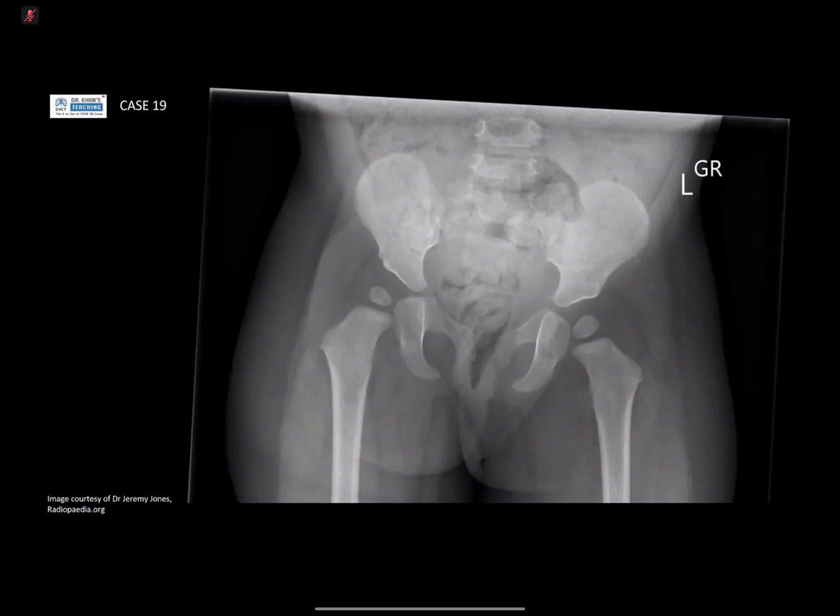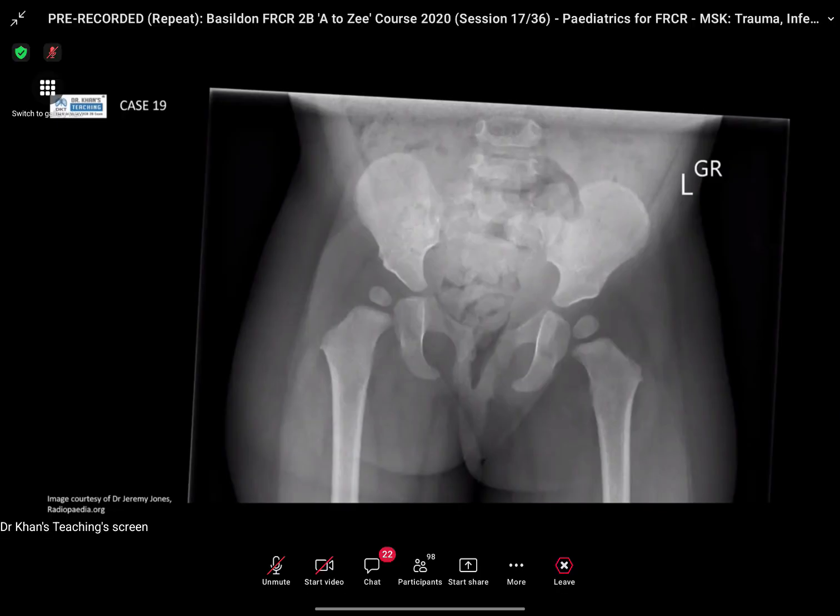This is a pelvis X-ray for a skeletally immature patient. Okay. What's the history? What is the patient complaining of? Altered gait. Okay. Is there a family history? The patient was firstborn, born in a breech presentation.